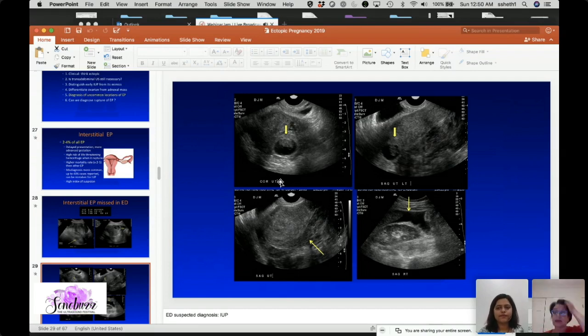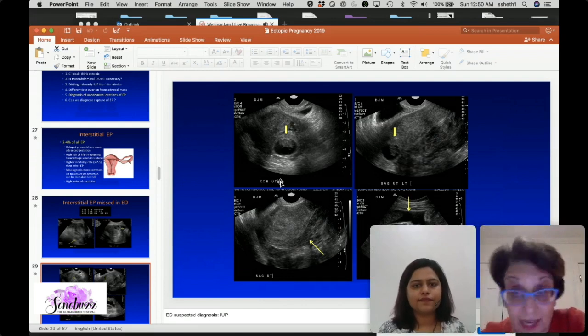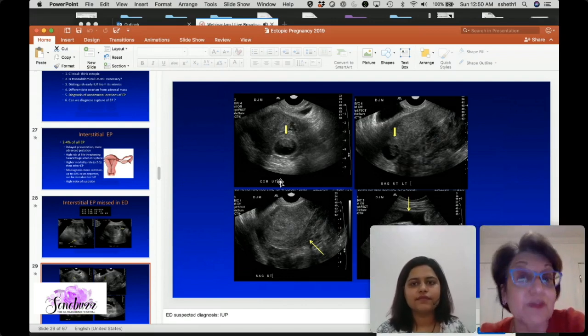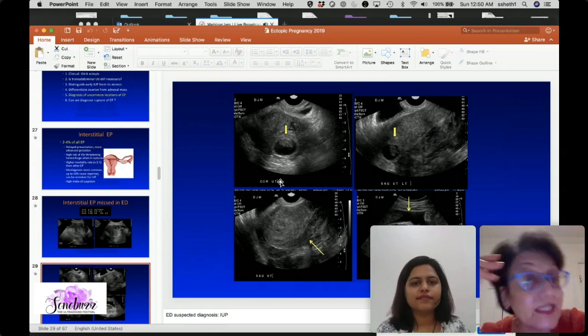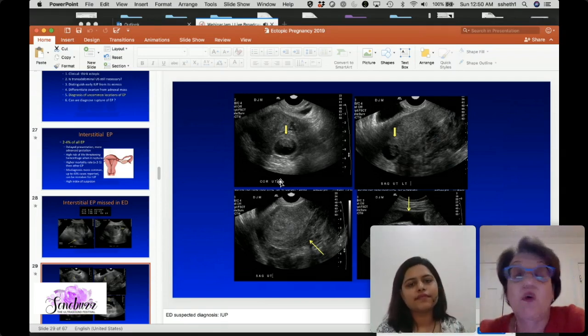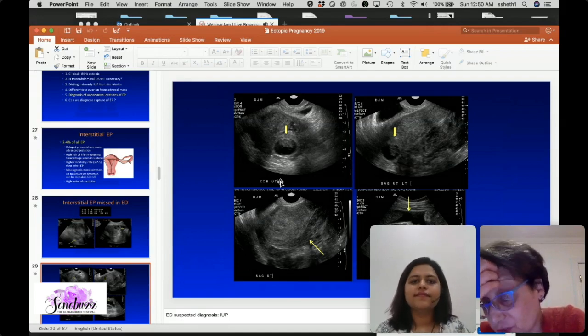Follicles can be PET positive because they have neovascularity. That's normal. So not every PET positive ovarian lesion in a young woman is going to be an ovarian cancer. That's very important to stress as well. So if you see a PET positive ovary in a woman, probably get an ultrasound because you'll be able to characterize it better.